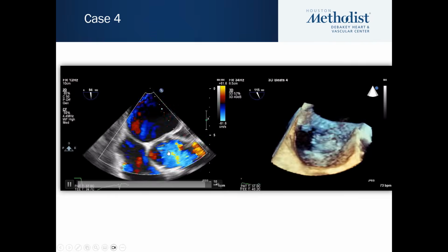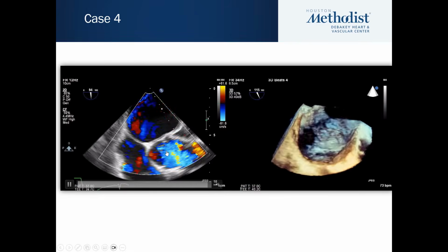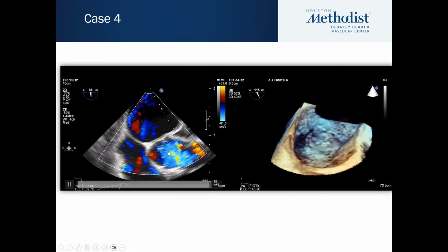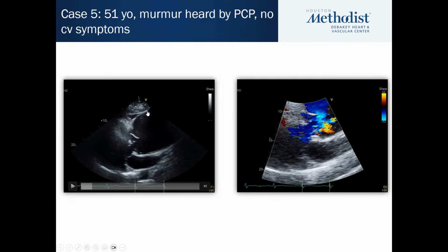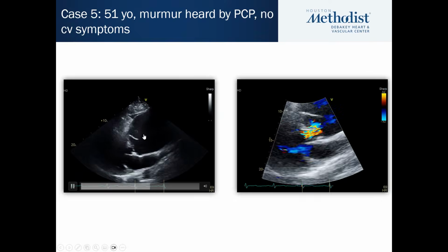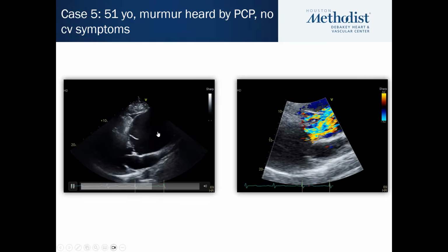Notice the destruction here on the aortic valve is also not necessarily going to be a small circular hole. Notice how you have what probably is a perforation along this line. This patient got surgery. Here's another example of a dissection. So this person was found incidentally, according to the chart, has a huge aneurysm, and you see a dissection flap here. There's multiple ways that dissection can actually induce or cause AR.